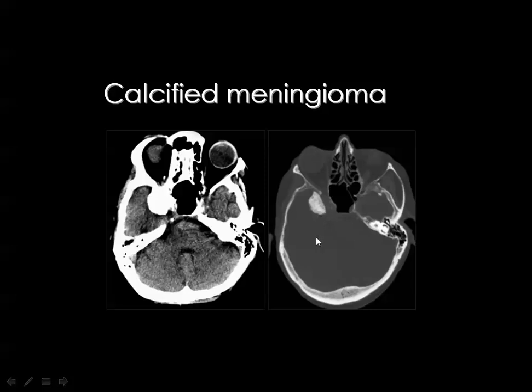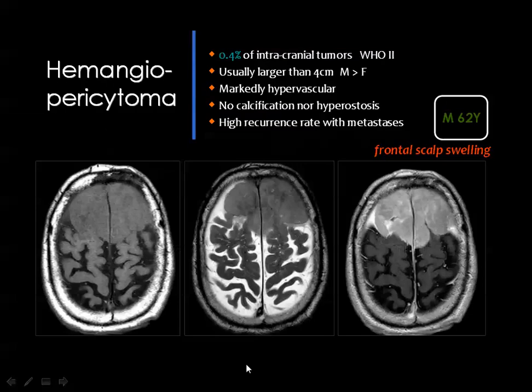I usually say that if you are confronted by a mass like this formed of bone density, it is better to diagnose this as a meningioma which has been totally calcified, and do not rush into the diagnosis of an osteoma of the calvarial bones, because meningioma here is more likely to occur from the inner table, but osteomas are usually related to the outer table of the calvarium.